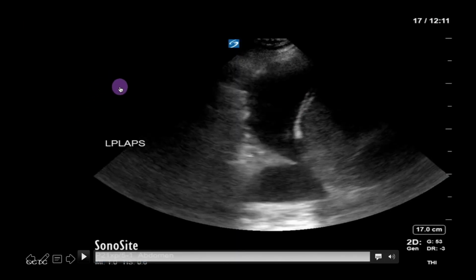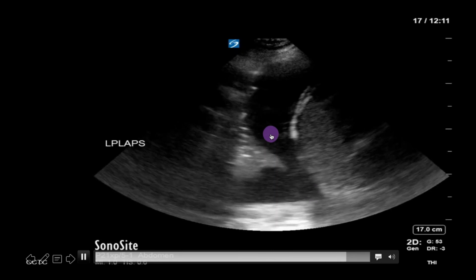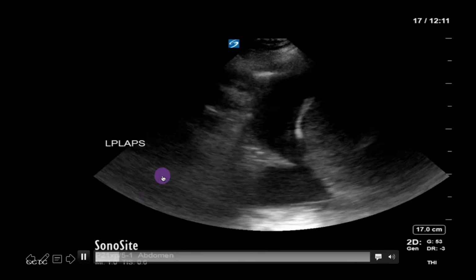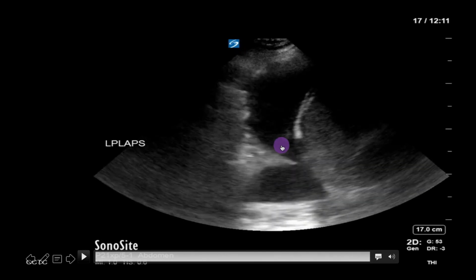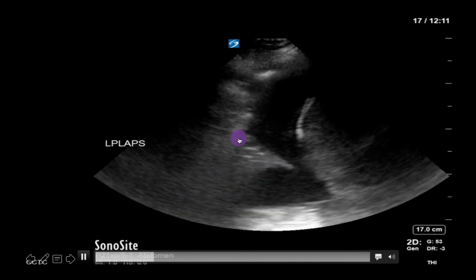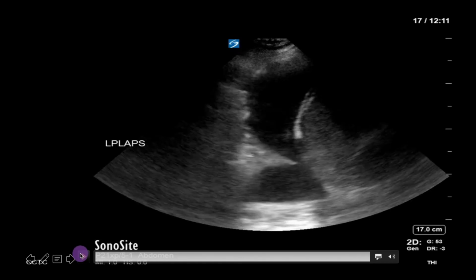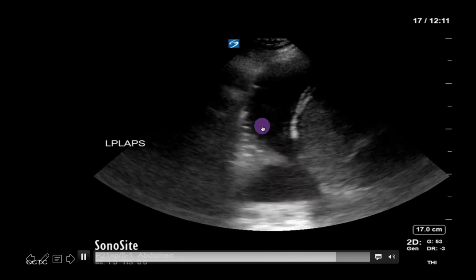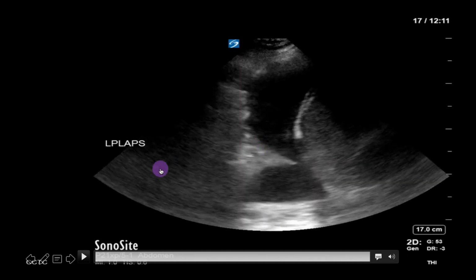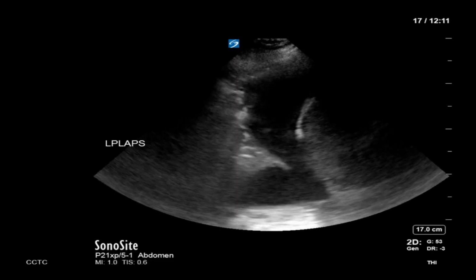The last artifact we'll discuss, but certainly not the last artifact there is, is beam thickness artifact. This results from the ultrasound machine compressing returning information from a three-dimensional structure into 2 dimensions. This can result in phantom-like images around the lung. It's important to distinguish these from things like complexities in a pleural effusion. The phantom images' inconsistent presence in time, as well as simply seeing how they persist when you scan through them, will help you understand what's really happening inside the patient.